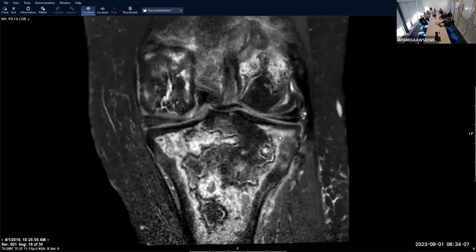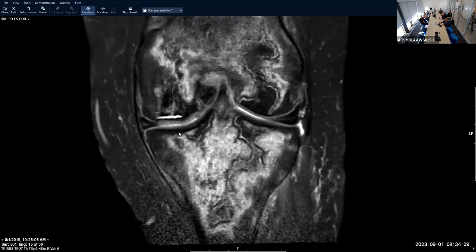And so would you guys think this is stable or unstable? Unstable, right? So what determines that? This is what happens when you answer questions, people ask if you have more questions. Anybody know? Maybe group discussion.